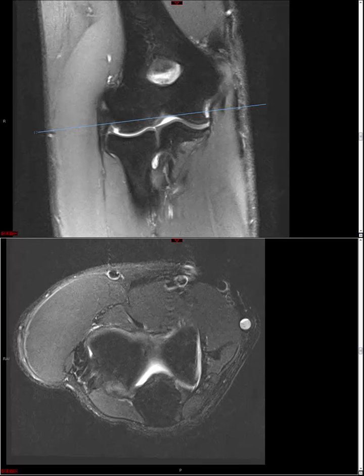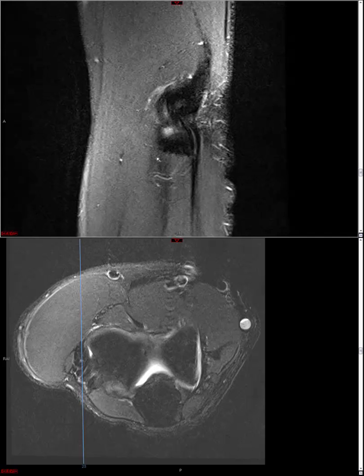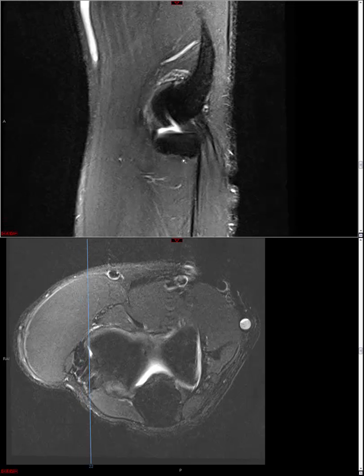And just briefly, I want to pull up the sagittal sequence corresponding to this region. Okay, so here we go. And I just want to press upon you how intimate the radial collateral ligament origin and the lateral ulnar collateral ligament origin are. So not unusual to have tears of both structures with the common extensor tendon when you have lateral-sided elbow pathology. So it should not be unusual to call multiple injuries to all these structures on a routine basis. And once again, the ligament should also be low signal homogeneous in the normal situation.